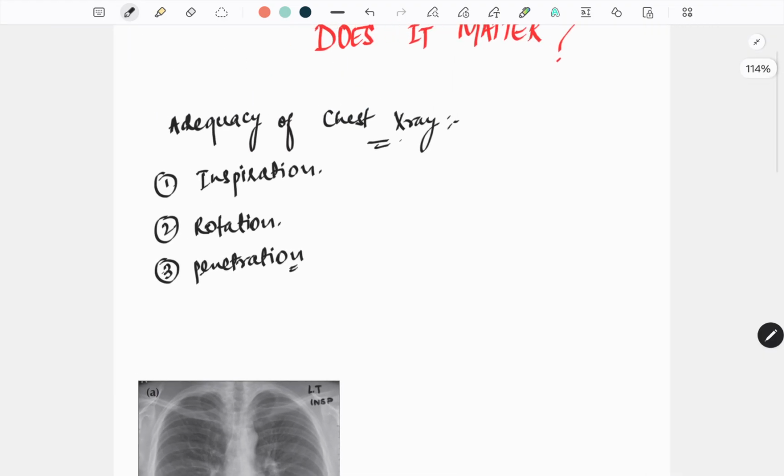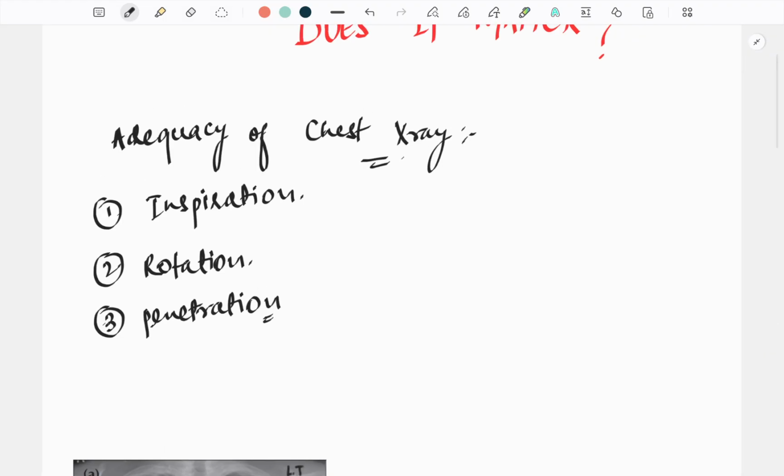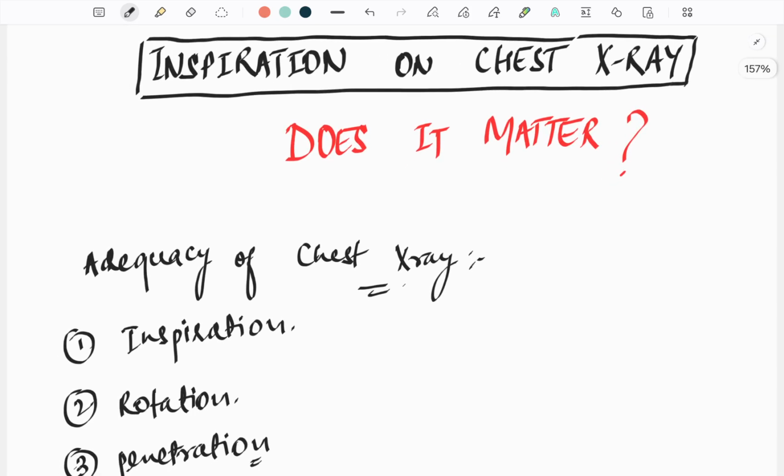penetration. As you all know, we are now using digital X-ray radiography. So whether an X-ray is under penetrated or over penetrated, we can manually improve that. Okay. Now we'll come to today's topic of this video, inspiration.